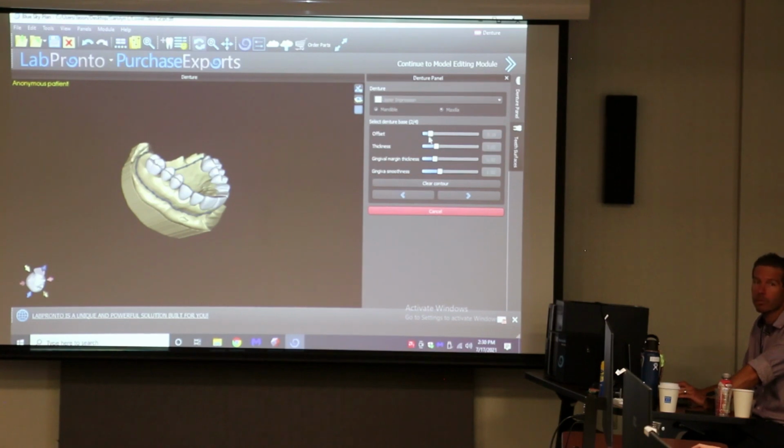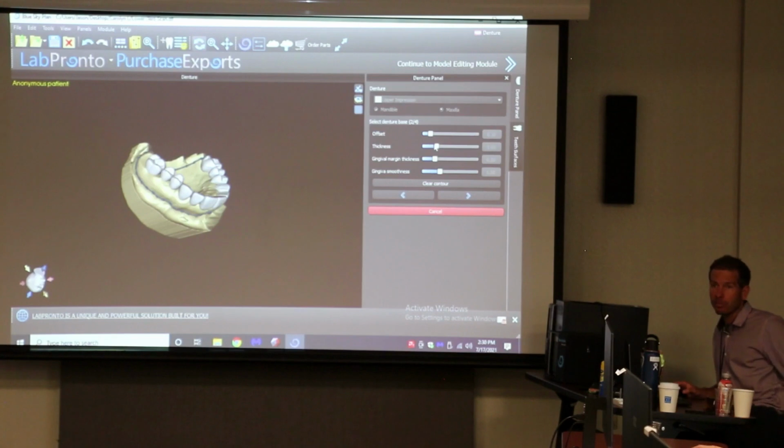I think having a little bit of room for slop and play and just some reline material is a good idea. It defaults to 3 millimeters thickness. And Brady, this goes back to you talking about custom trays, you like 3 millimeters. These dentures I put at 1.5 millimeters because the 3 was very thick for a denture. I mean, imagine a 3 millimeter thick denture. That's a lot. That's a thick denture. 1.5 millimeters, I have not had one break yet in the MFH. They're strong. So I've been doing 1.5 millimeters.